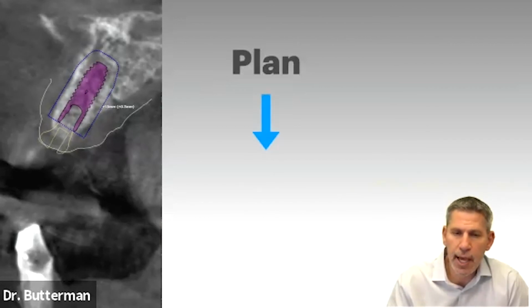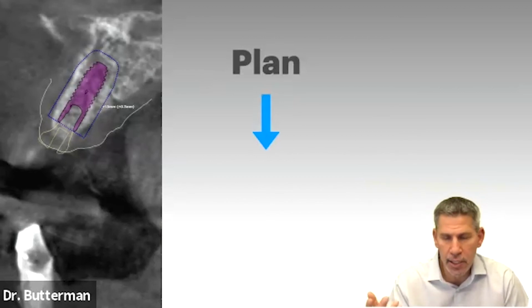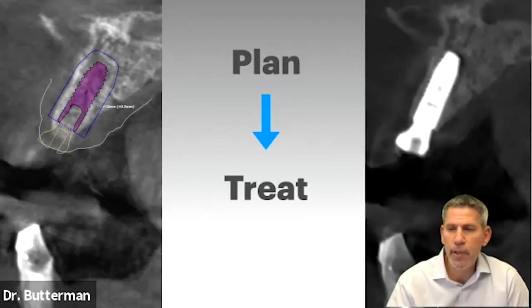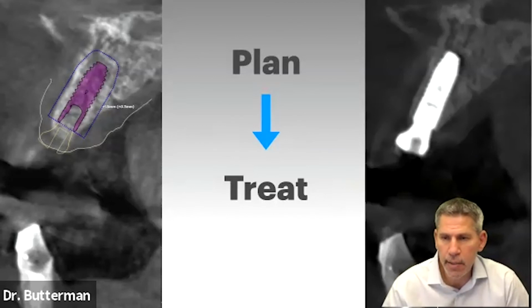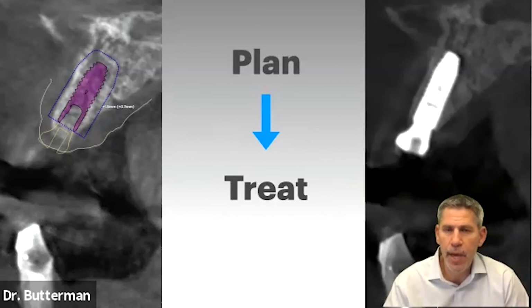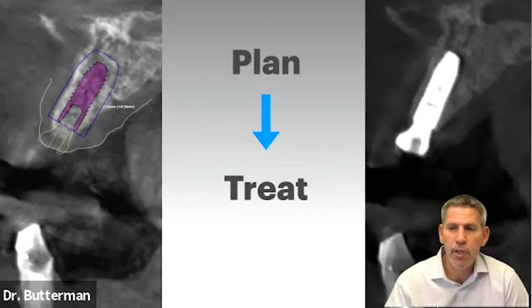And what you're looking at now is a different system. It's an Axeos scan and it's CEREC scans, but I used a system called a Zento to plan and map this case. But we can see our pre-op and we can see our post-op, and we can know, yes, there's a buccal plate. My implant was positioned correctly at the time of surgery, and at least on day one, we know that we've done everything right, and it really can cover your butt. And you know that legally and medically, you've got everything done right here.